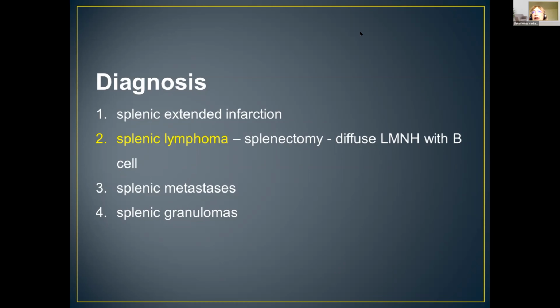We supposed it to be some viral pathology. In my patient, it was proved to be lymphoma because we made splenectomy, and I really don't know why the lesions were not visible on CT. In our cases, it was a short time period when we have lymph nodes, and after that, in less than 2 weeks, we don't have any lymph nodes.